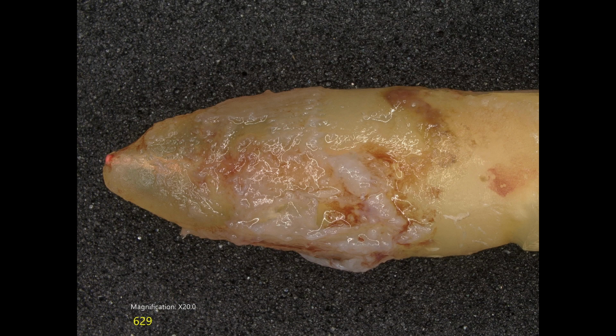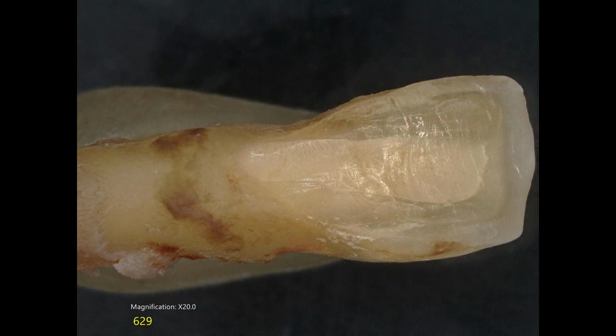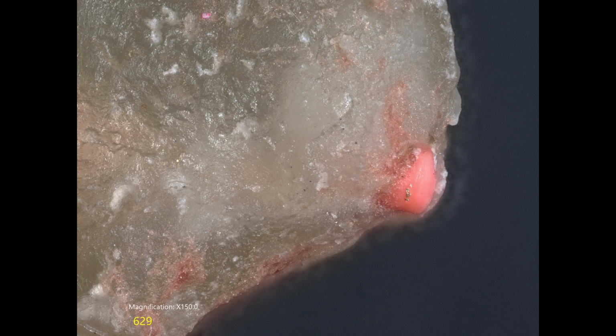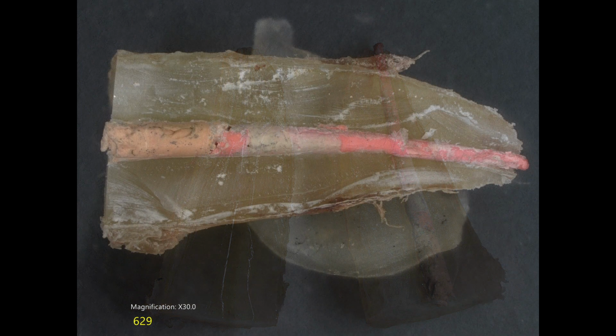I received the tooth intact in neutral buffered formalin. I took a few high-resolution photographs of the root, incisal restoration, and terminus. No crown or root fracture of any kind was detected. We took buccolingual and mesial-distal radiographs, and again, no fractures were observed. The tooth was split sagittally into two halves as described in prior tutorials.